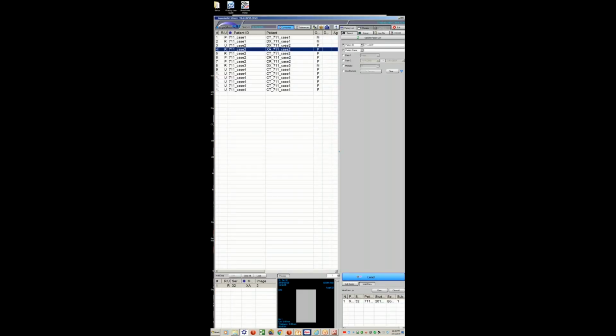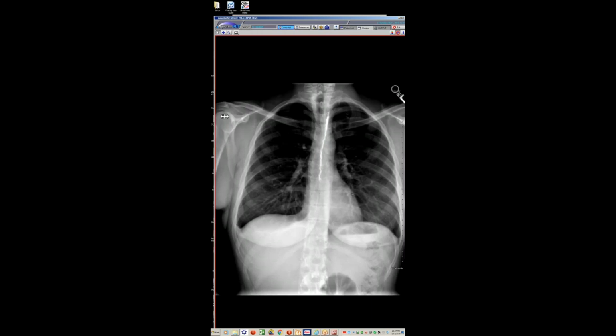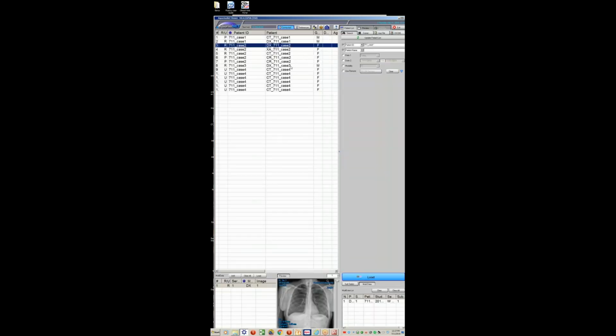And then here's the fluid type. And they did a really nice job. Here's the post-treatment radiograph, where they basically coiled, embolized the thoracic duct, and her effusions resolved. I don't know what the long-term sequela of this is. I would assume that other lymphatic pathways would form, but I'm not sure.